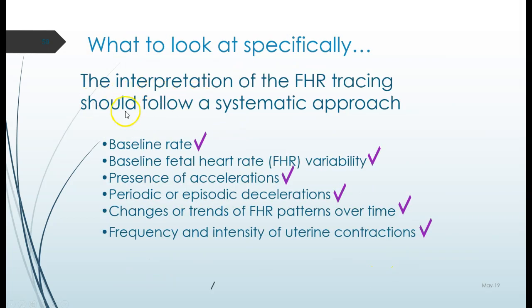We said that through this, you're going to be able to interpret the fetal monitor by looking at the baseline rate. Hopefully you can look at a strip and tell where it's hanging out most of the time. Talk about the variability. How much fuzzy is on that baseline? Variability is a baseline characteristic. Then we have the presence of accelerations.